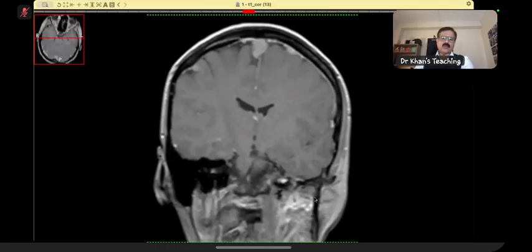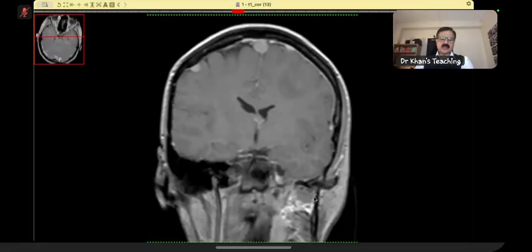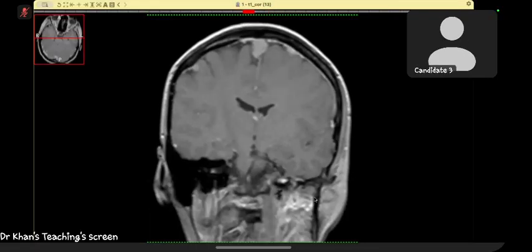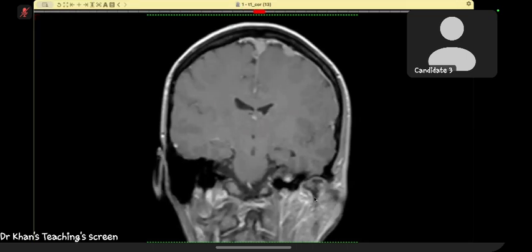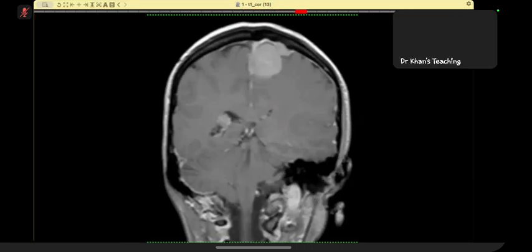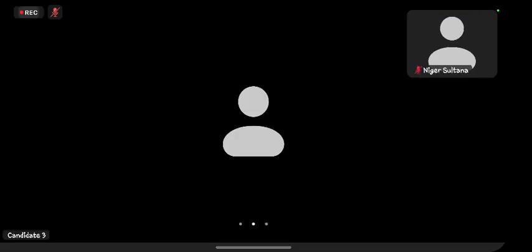So my whole debate is what is the criteria and has the criteria been met in this case? Sir, exactly, all three lesions are not met, but ependymomas and meningiomas are present. Okay, thank you. Thank you, sir. Now, this is a case of NF2.